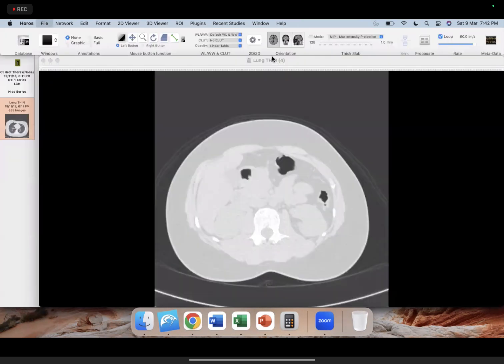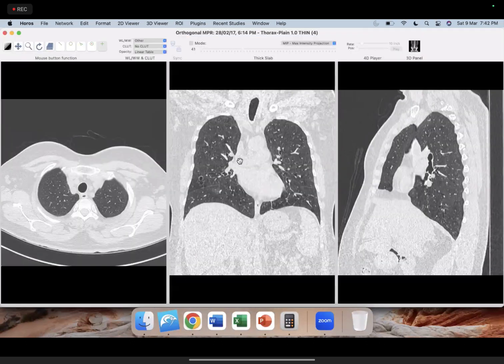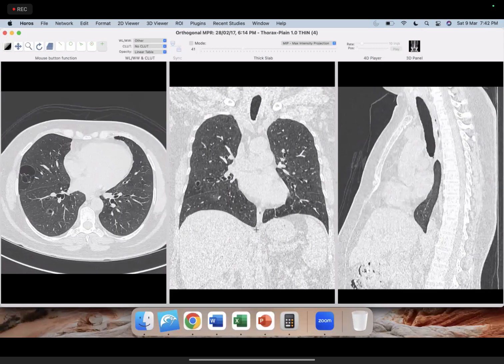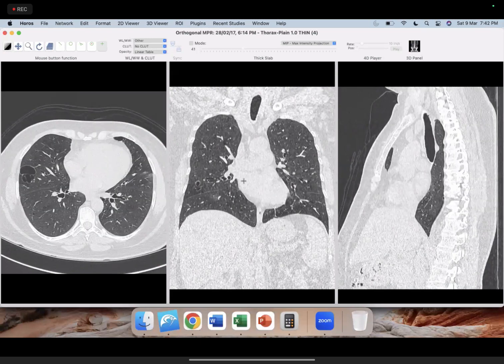And then we have one more example of this type, since we are covering the cystic lung diseases. Let's see this example also. So now what do we have? Again, we have a female patient. So this is good, we have all female patients just to tell you that not every female with cystic lung disease is LAM. So again, what do we see here? We see cysts. It almost looks like the first scan, right? So if you are thinking first L for LAM, it's not going to be completely wrong.